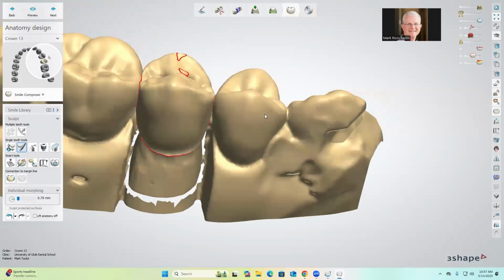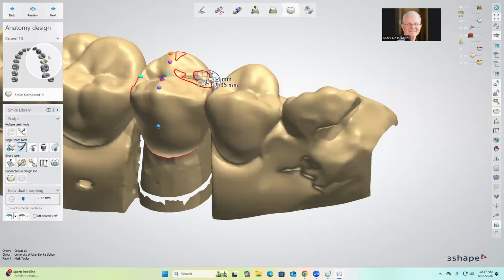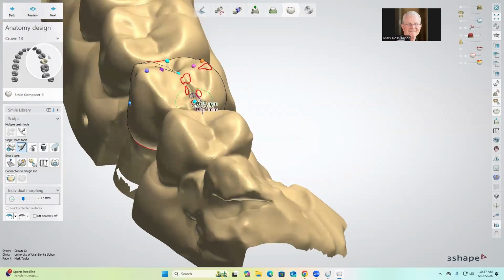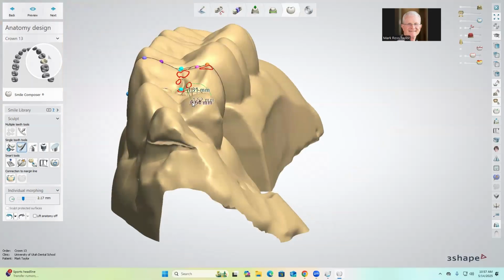As long as it's sitting within a flat slope in here, we should be good, and we should have one right here. I can't really create one, and I'll show you exactly what I mean. If I try to create one on your mesial and distal marginal ridge, you're going to see how high I have to make that marginal ridge when it's sitting up higher than the adjacent tooth. So you have to ask yourself, do you want one on the mesial and distal marginal ridge, even though those ridges are going to be higher than your mesial or distal tooth?